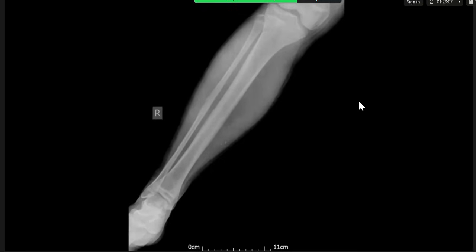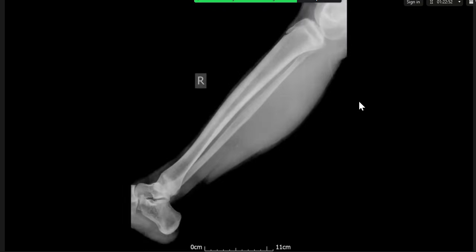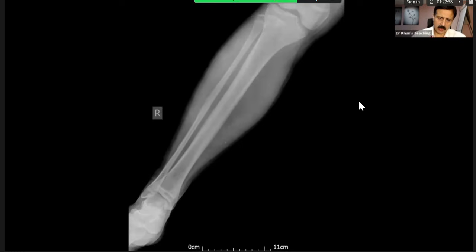And I can also see foci of calcification, which would be unusual for a patient of this age. Putting all these together, I'm concerned about a soft tissue process causing an extrinsic compression on the bones. And right. So this is the lateral? Yeah, and the lateral confirms this, where you can see a posterior increased soft tissue density with phleboliths. Okay, so just one second. Let me recap for everybody.